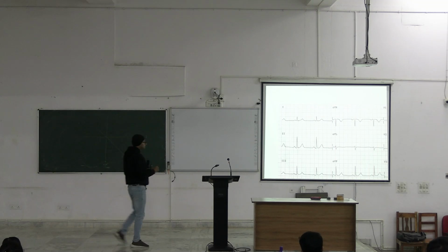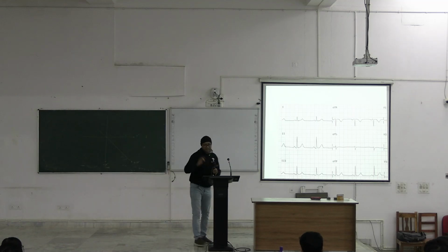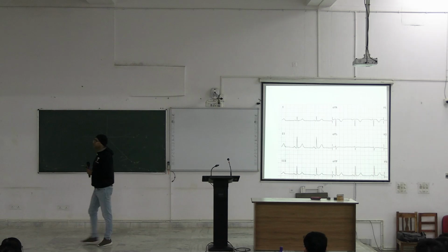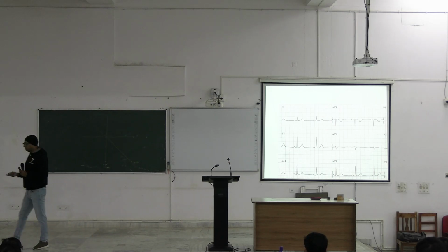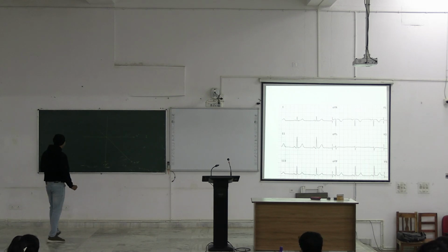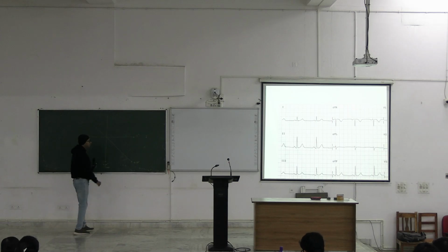Now, with the help of a scale, you need to draw this. If this question comes in your professional examination or in the practical examination, you need to draw this lead 1 and lead 2, right. And at an interval of 1 centimeter or half centimeter, but it should be equal for all the axes.